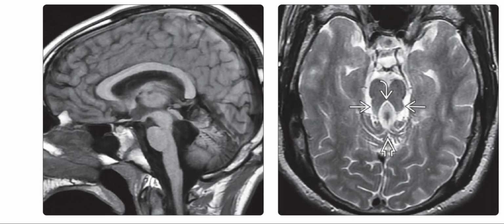In these images, we can see that the image on the left is the midline analysis of posterior fossa structures, and it shows an upwardly convex superior fourth ventricle and a dysplastic appearing vermis. In the right image, that's the axial T2 weighted MRI in the same case, and it shows the elongated fourth ventricle, cleft vermis, and thickened horizontally oriented superior cerebellar peduncles, forming the classic molar tooth sign of Joubert syndrome.